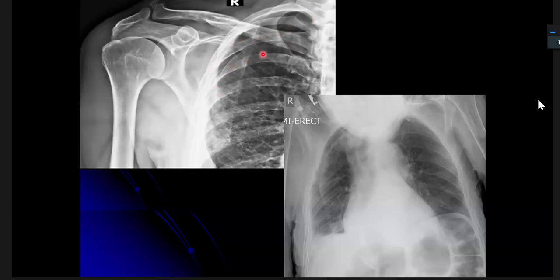So basically, when there is a true pneumothorax, vascular markings will be 100% absent. The pleural line will be very thin and very sharp, as you can see. It does not fade away medially or laterally, and it does not extend beyond the chest wall, which favors a pneumothorax.